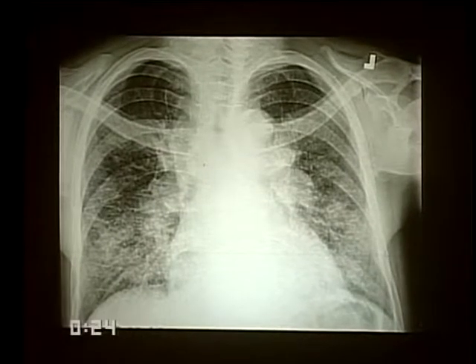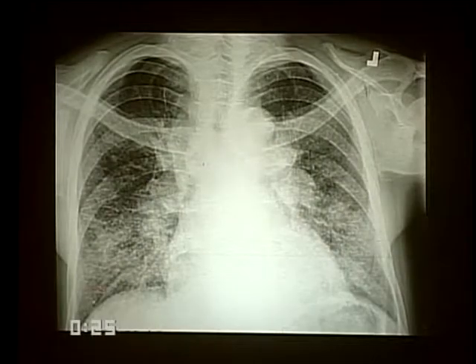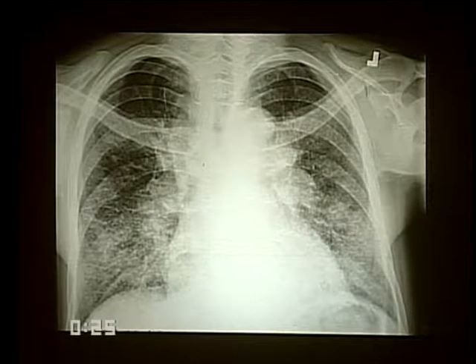Lymphangitic spread of tumor may be diffuse. It may be cortical, it may be medullary. Most of the time, it is dominantly in the lower zones. This is a person with metastatic melanoma, which has gone to the hilar nodes and gone to the periphery, dominantly in the bases. While we define this radiologically as lymphangitic spread of tumor, in actual fact, most of these metastases reach the lung through the bloodstream and just elect to grow up and down through the interstitial planes. Hence, they tend to be dominant in the bases.